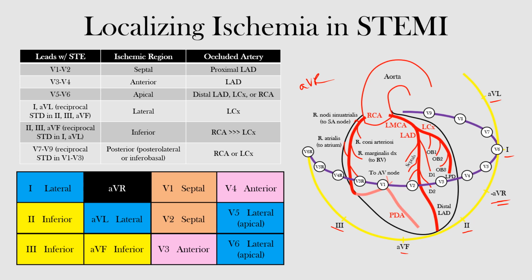Then you can also see all the precordial leads placed here. Here's V1, and as you continue all the way to the left side, V2, V3, V4, V5, and V6. And we've also added here V7 through V9, which are our posterior leads, so they're coming around the back of the heart. Going to the right side, we have our right-sided precordial leads, where V3R all the way up to V6R. So we have both the horizontal and frontal plane present here.